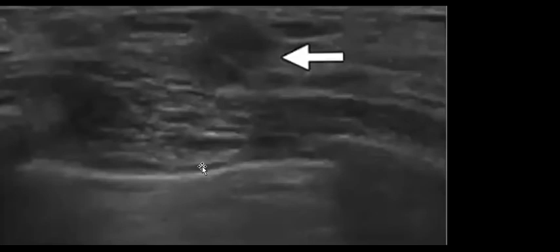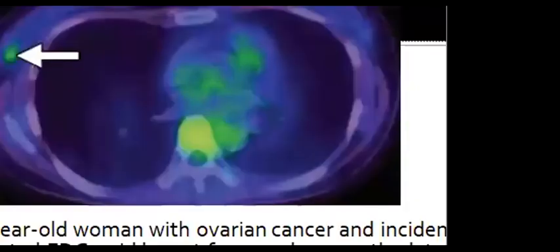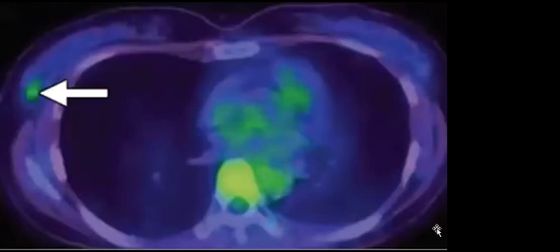This patient, another patient, did an ultrasound, and the person who did the ultrasound found a very small nodule, and took a biopsy from this nodule, and it looked like invasive duct carcinoma. They suspected that there could be lymph node metastasis, so they did PET-CT for this patient. So what do you see here?